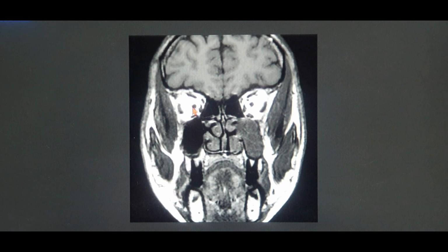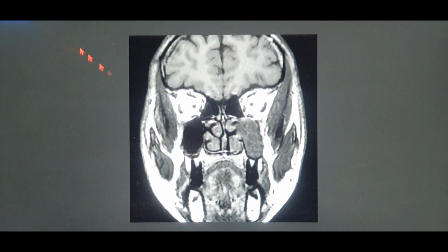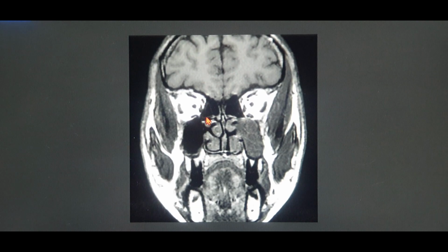Now this is basically a T1 image of the patient. In this case you're not able to see the globe, vitreous humor, or CSF, but still, why is this T1? Because the brain parenchyma, the white matter, is appearing as white. This is how you can identify that it is T1.